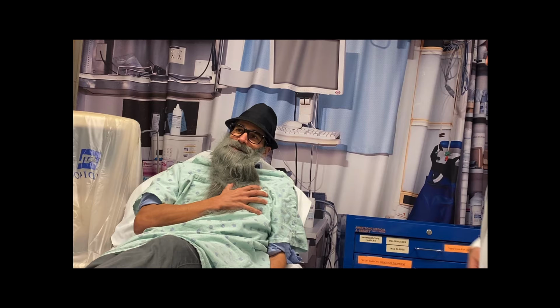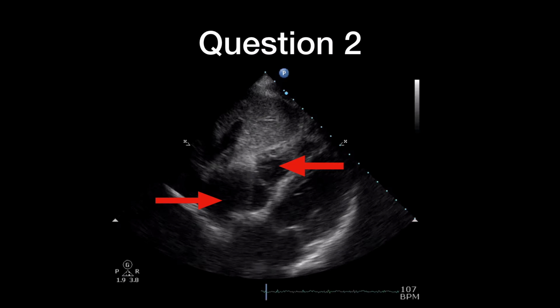So question 1 really was just to upload your images. And then question 2 asked you to think about what you would do in a patient with pulmonary hypertension. So Mr. Brokestone has been smoking his whole life. That is a risk factor for pulmonary hypertension. And you were to take one of your images and put arrows where you thought you would see chamber dilation in someone who had pulmonary hypertension. And we talked about in class, the right side of the heart is what supplies blood to the lungs. And so if you had high right heart pressures because of high pressures in the pulmonary arteries, you would expect to see dilation of the right-sided chambers.